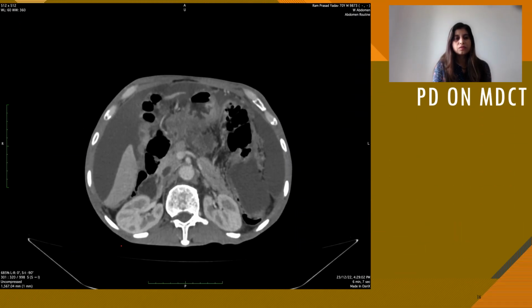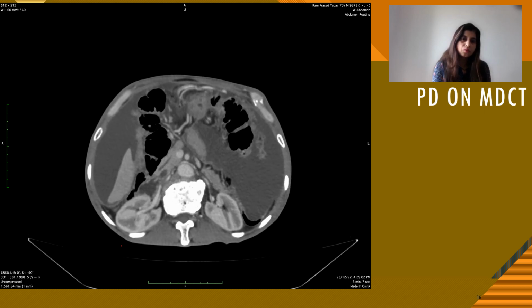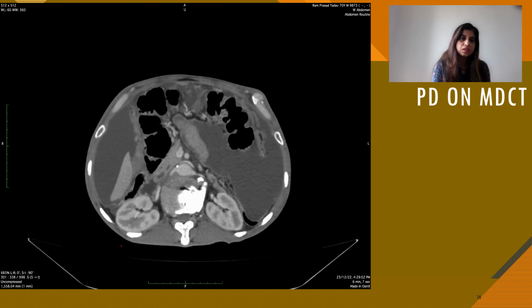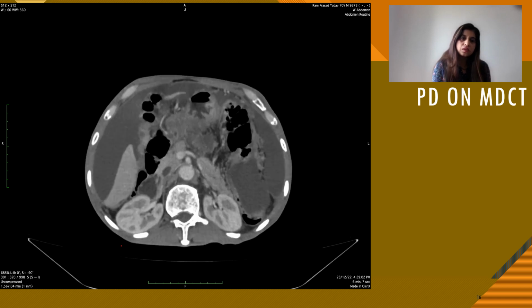and this is the video. Here we can see the dorsal pancreatic duct, which is coursing anterior to the CBD, not joining the CBD, and opens cranially, and this is the ventral duct, which joins the CBD to open into the major papilla.